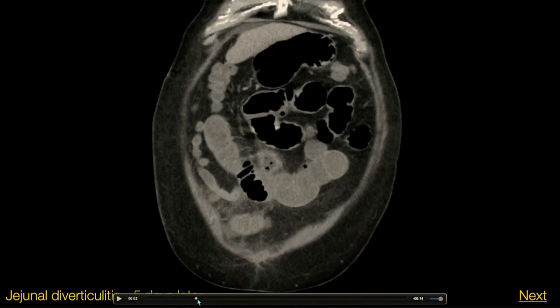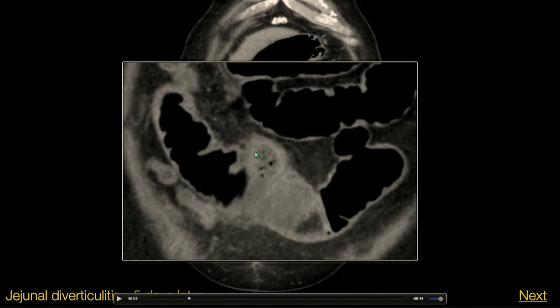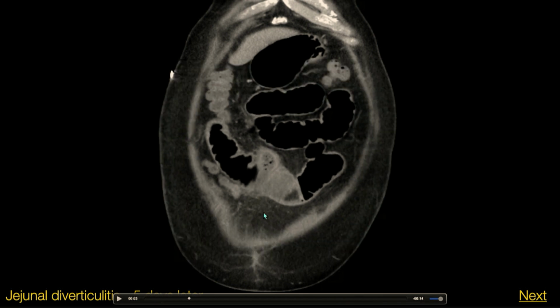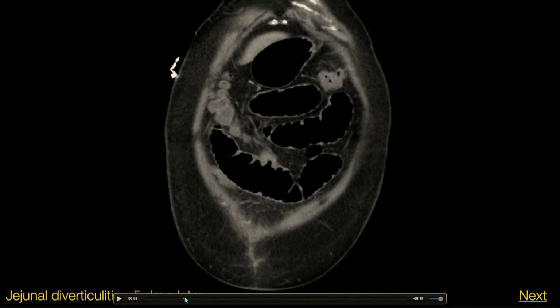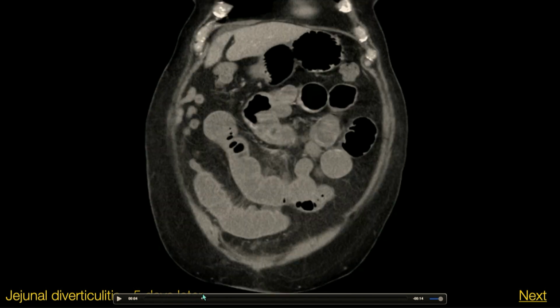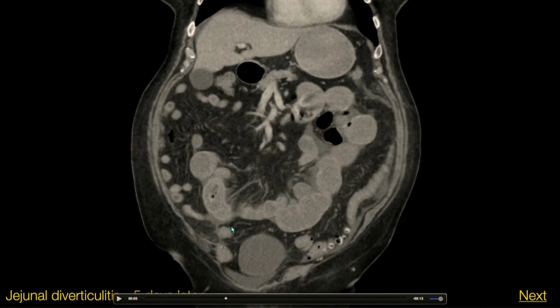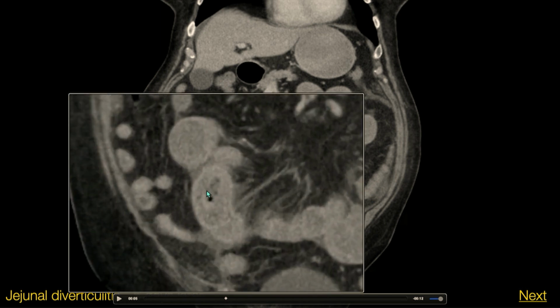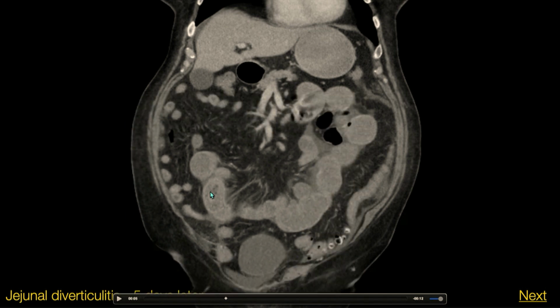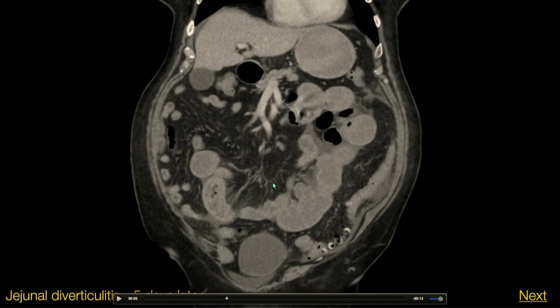A little bit of a different picture this time though, right? So that diverticula has largely decompressed, and the inflammation surrounding it is getting better, probably what you'd expect in 5 days, but now there's an obstruction. And where's that oval structure that we saw before in the lumen? It's not really there anymore. So scrolling down and following the dilated small bowel into the right lower quadrant, we find that oval structure, maybe kind of blending in with the enteric contents, but this is the cause of obstruction, and so that migrated and caused small bowel obstruction.